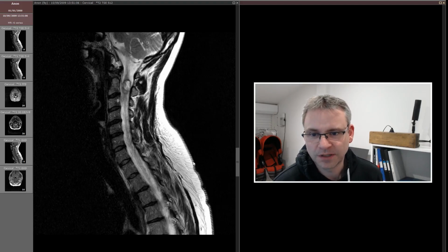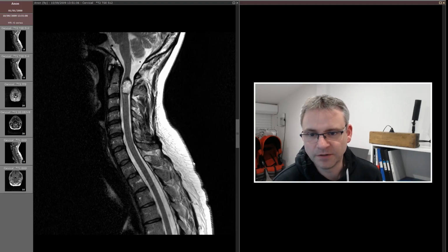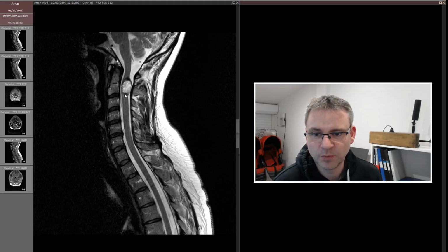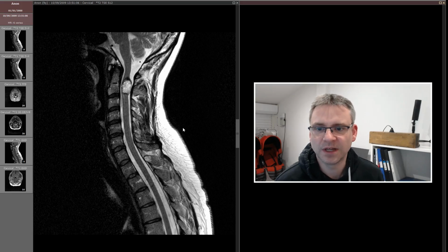Here's an intramedullary lesion at C2 level that looks a bit odd. There isn't much edema generated by it. It hasn't caused a syrinx. It appears to be a solitary lesion, and there's a little bit of low T2 signal at the top and the bottom of this at the cranial and the caudal end, which sometimes makes you think of something like an ependymoma in a younger patient, the hemosiderin cap that's described in the textbooks. But a little bit odd that these other features are missing.